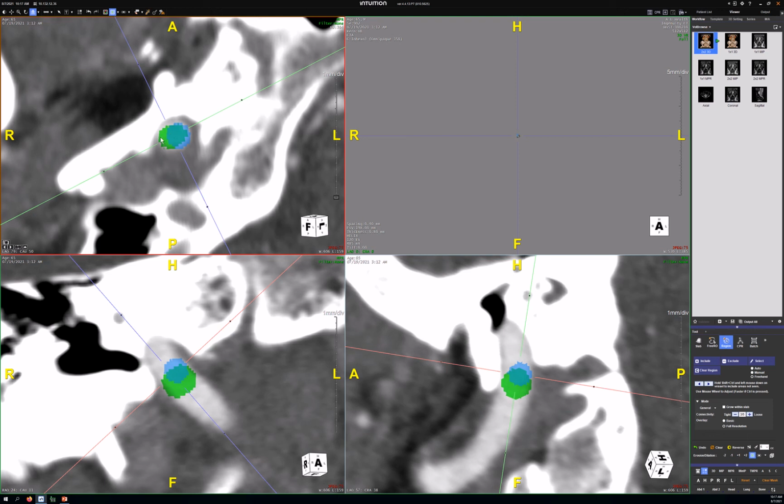So hold down Shift and bring the edge to the edge, and then click it. See how it added some blue down here? Right there. Yeah, that you didn't realize. So you're not picking up bone anywhere, right? So now hit Include.